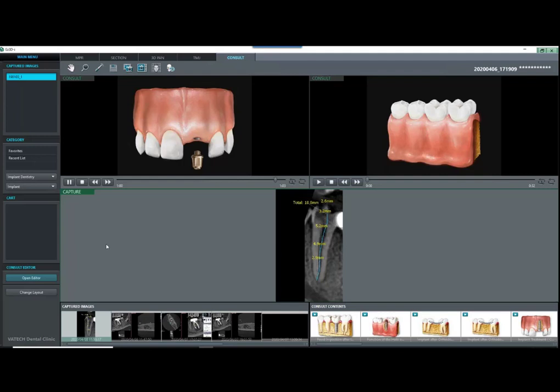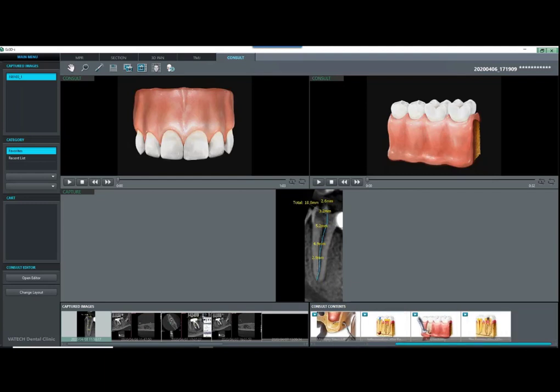But most of my offices are doing a right click to do favorites, so their hygienists can talk about different clinical education for our patients after their treatment while they're waiting for the doctor to come in there.